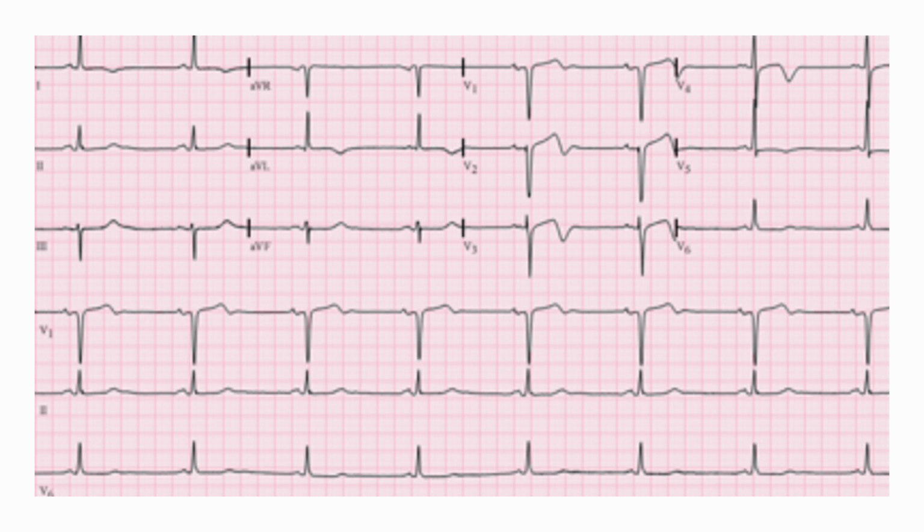This patient is coming with chest pain, and you get this ECG. If you closely look at the septal leads, there is a biphasic T wave, and this is very classical of Wellen's syndrome. And this patient is similar to De Winter's T waves, either a proximal LAD or left main lesion, and this patient needs to go to the cath lab.